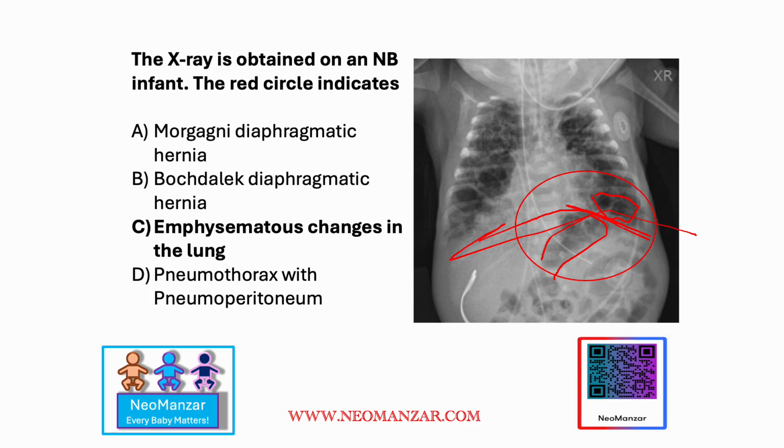Again, let me draw it to make sure that you guys get the idea here. Let's rub it off. Now you see, that's what I was talking about, you still see the diaphragm. So this is not diaphragmatic hernia. Now what's the difference between the Morgagni and Bochdalek diaphragmatic hernia?